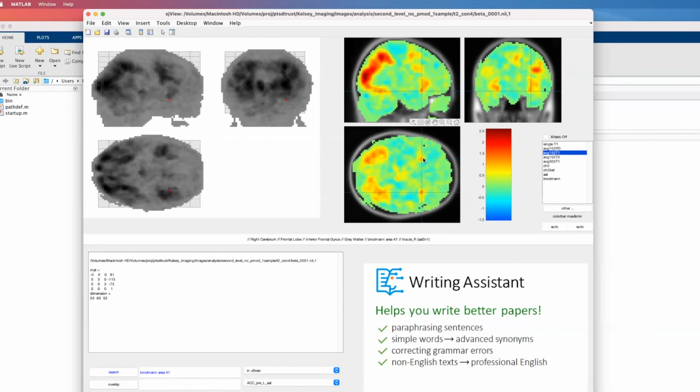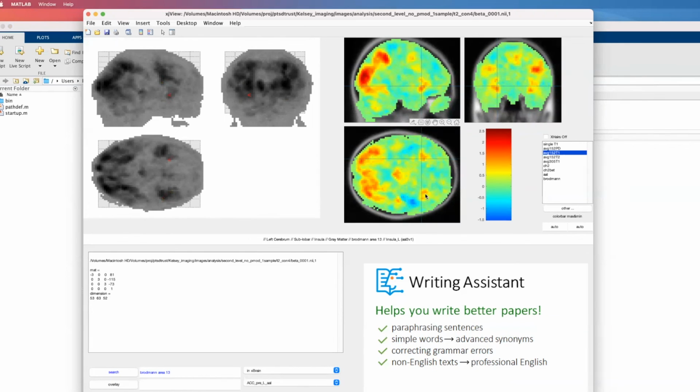So whenever they're seeing what the trustee does, just in general, this doesn't ask any questions about what the return was. It just asks, when they're seeing the return, what's the activation like? We have activation in the insula as compared to the other parts of the task. So what does that mean? If the insula is activated, maybe we're getting a negative response. It's not super activated, but maybe if we look at places where there was poor return, this person has a negative response emotionally to having a bad return.